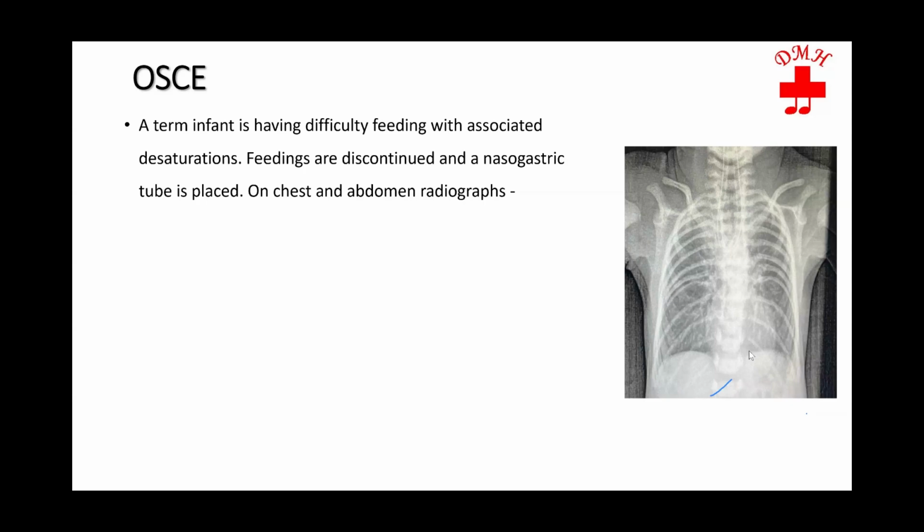TEF A type, rib unequal. Okay, Meghna, cardiomegaly, hyperinflated lung fields, rib crowding. Excellent. Okay, so you can see here ribs, right? So there are rib anomalies as well.